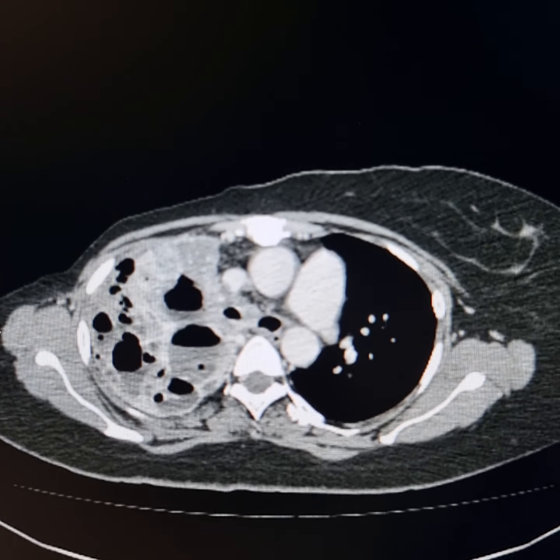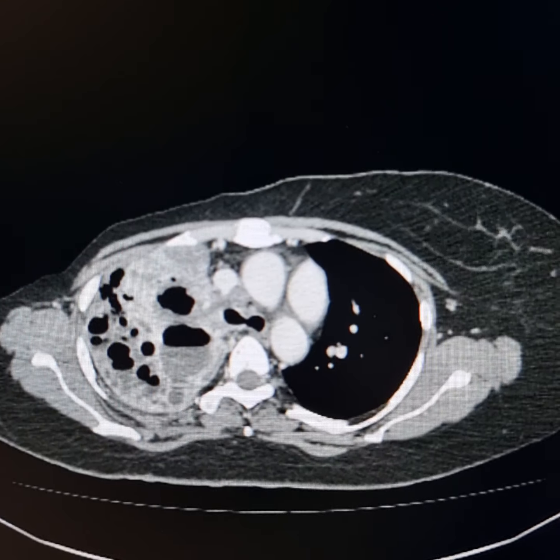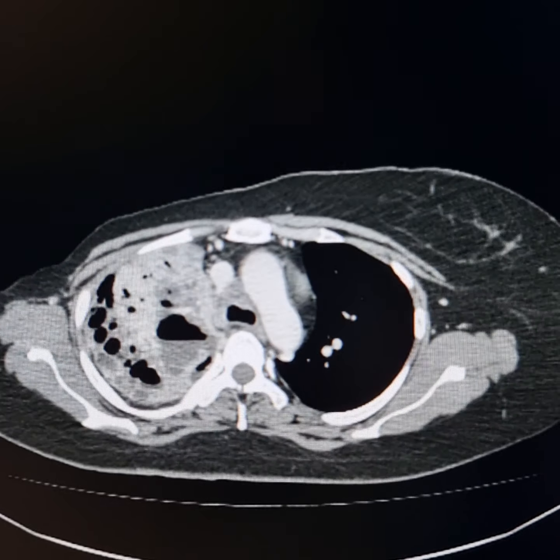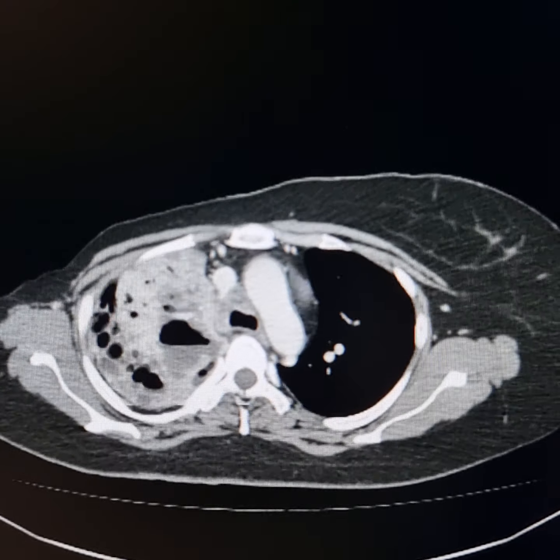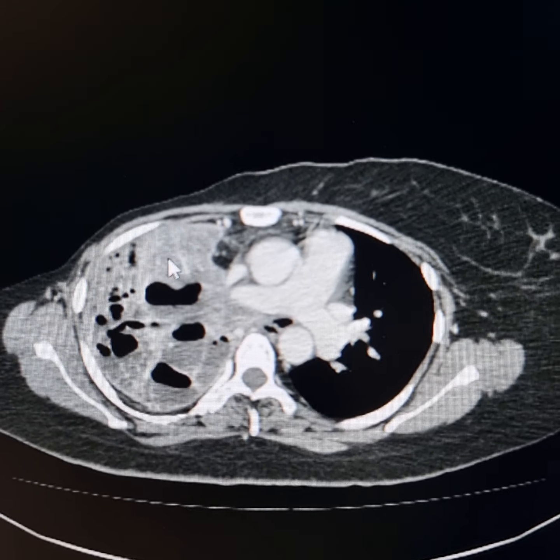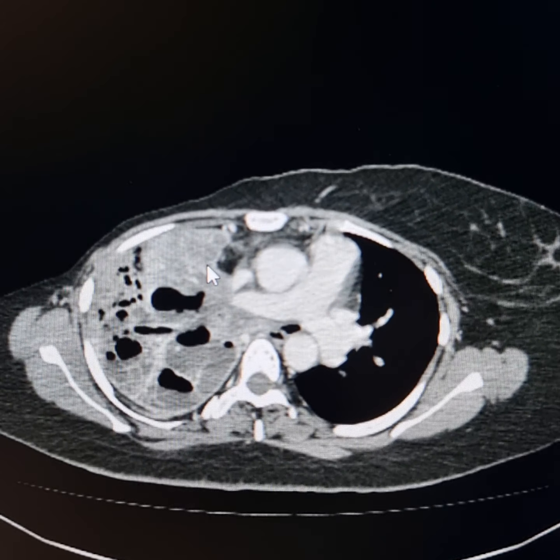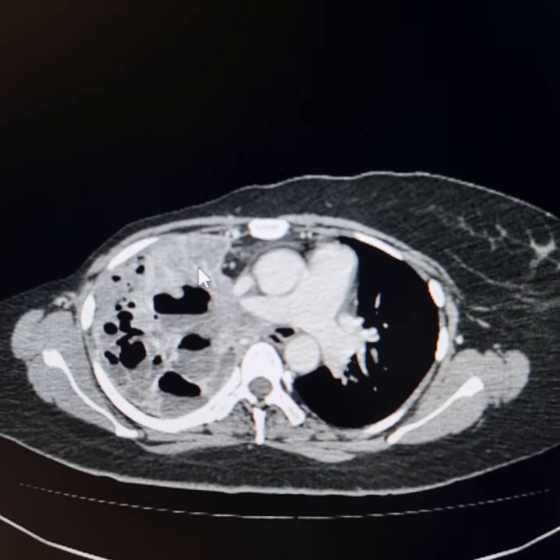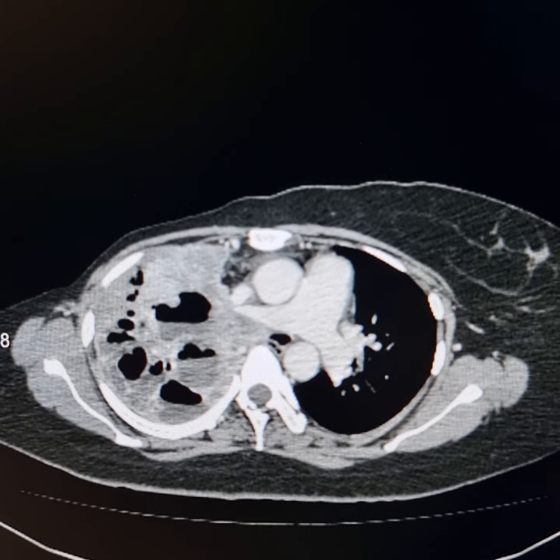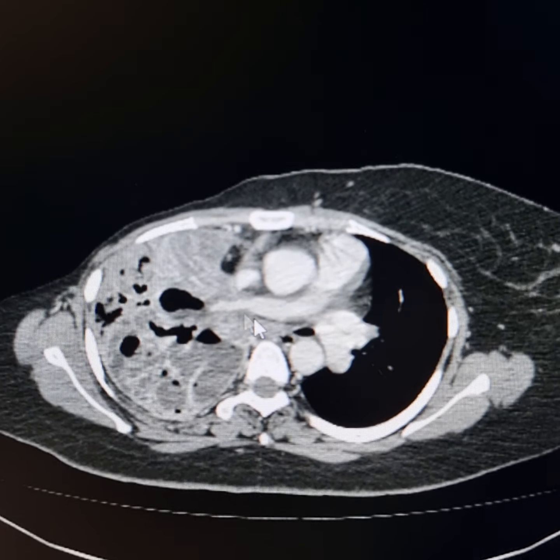Now, at times it does happen that the lung is consolidated distal to the growth, and we are not able to define the outlines or boundaries of the growth. Now just please see this area of the lung. This is consolidated. Pulmonary blood vessels are passing through this area of consolidation, and that is the routine. In a consolidated or collapsed-consolidated lung, blood vessels are seen passing normally through the lung.